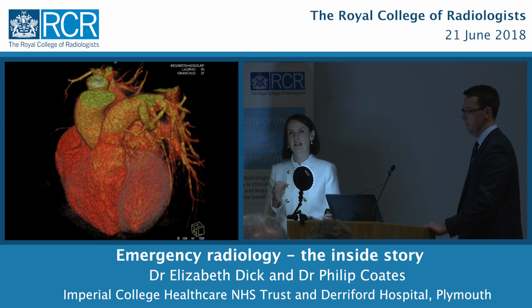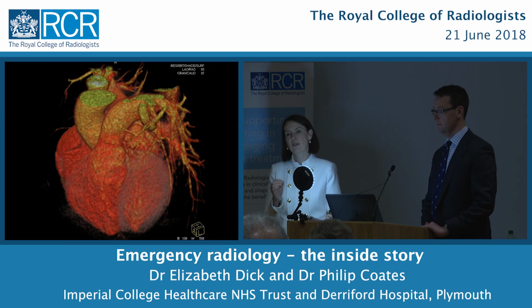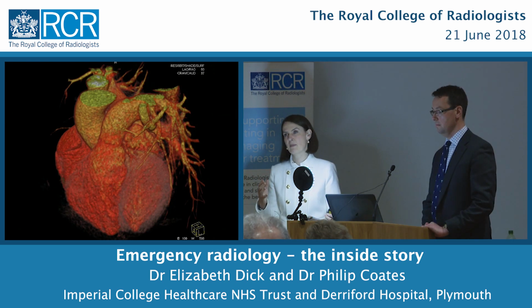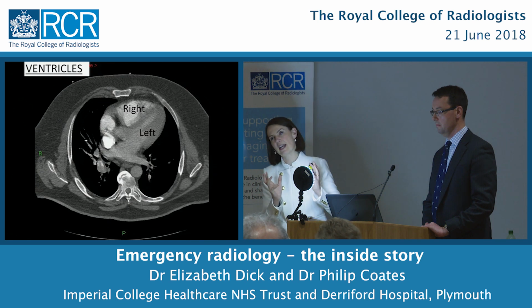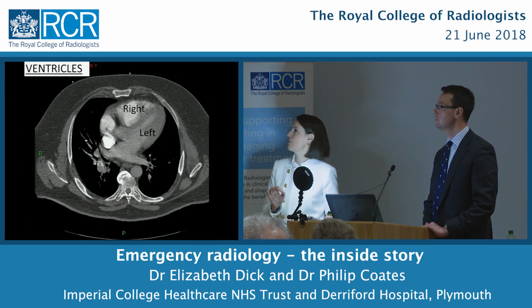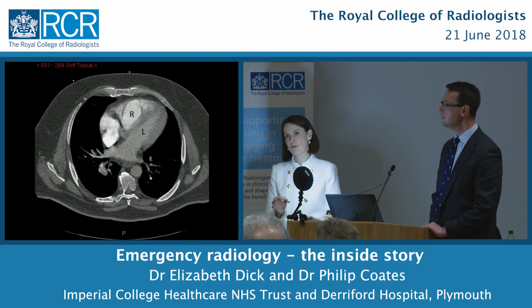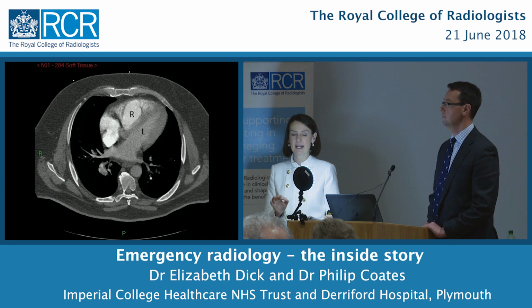Now, if that doesn't happen for any reason, or it doesn't happen as well because there's a clot in the pulmonary artery, the right ventricle will start to be under strain because it's pushing against the pressure and it can't overcome the pressure. So in a normal patient, if we look at the heart, we can see the right ventricle and the left ventricle, and the left ventricle should always be bigger than the right. But in this patient, the right ventricle is bigger than the left, and that is a bad sign.